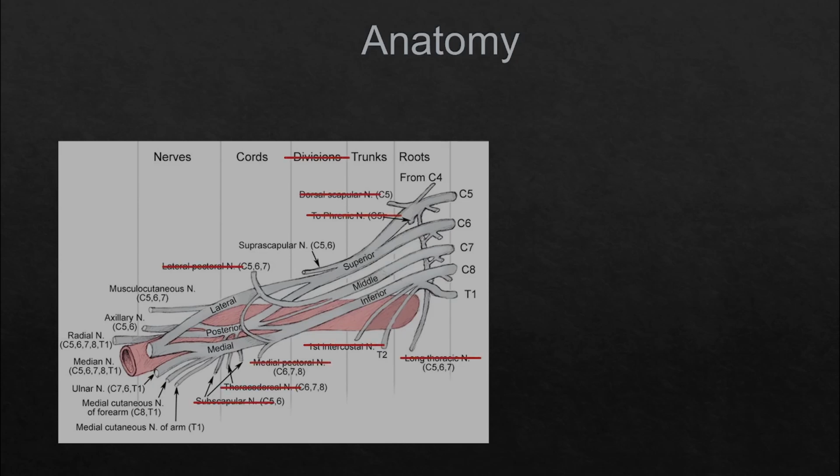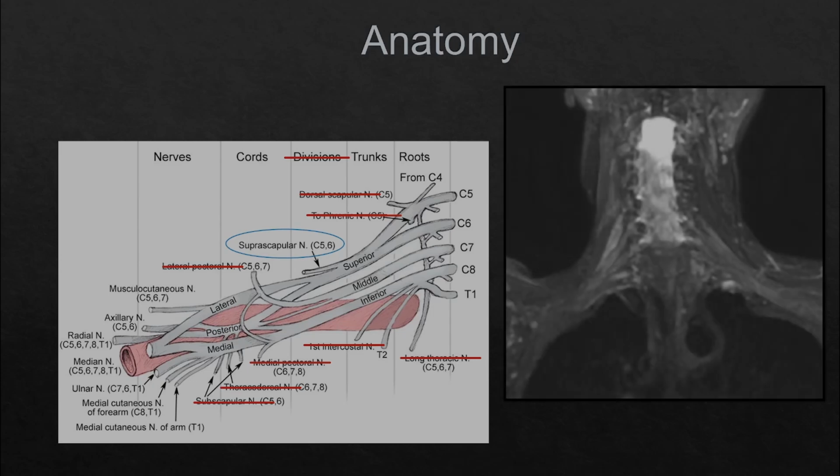Certain nerves are visible on high-resolution 3 Tesla imaging with custom planes, and the long thoracic nerve, for example, has been demonstrated in certain studies, but for all intents and purposes, these aren't visible on standard brachial plexus imaging, and the only nerve that is really visible to a consistent degree is the suprascapular nerve, as is seen on this coronal MIP study. This is useful as it is one that is often involved in pathology. The terminal nerves in the upper arm and axilla are usually not visible either, as we do not do dedicated axials through the upper arm, but if needed, these can be added on.